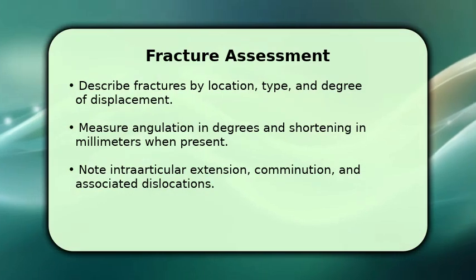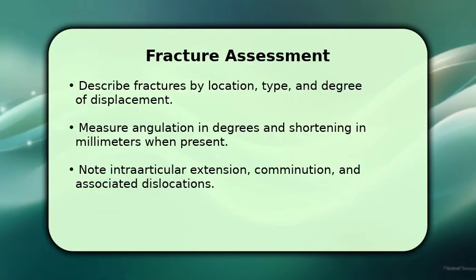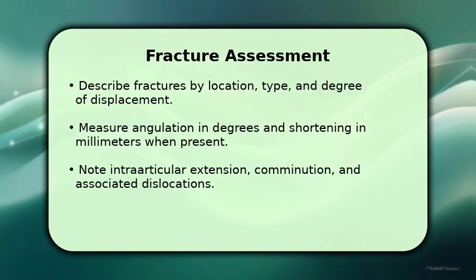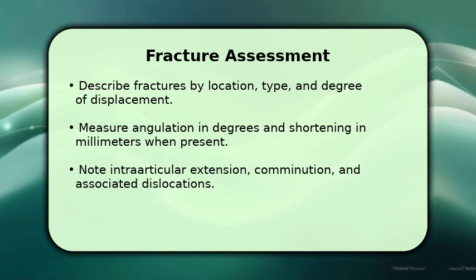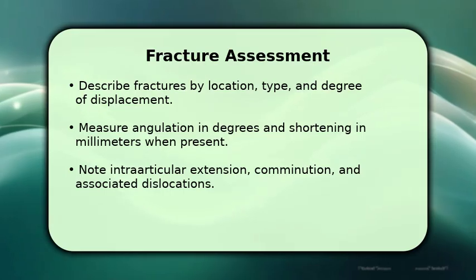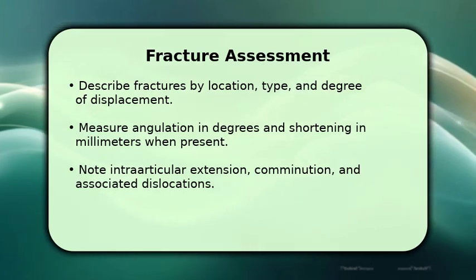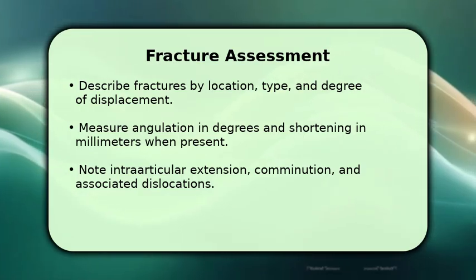Describe fractures clearly by location, pattern, and displacement to guide management and communication with clinicians. Measure angulation in degrees and shortening in millimeters, and report intra-articular involvement or comminution that affects treatment. Look for associated dislocations, tendon avulsions, or neurovascular concerns, and note urgency.